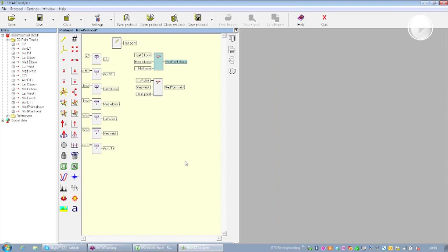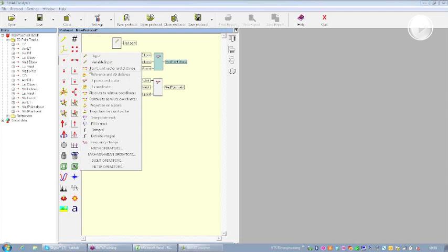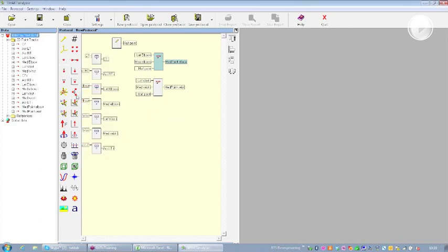So if I want to have an angle, I need to look for the creation of the angle. So I look for the chance to create this angle. That is going to be, let me look for it, angle between 3 points.